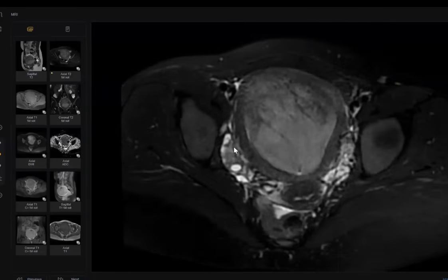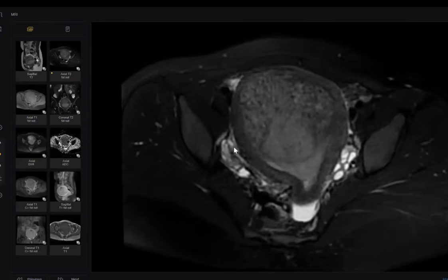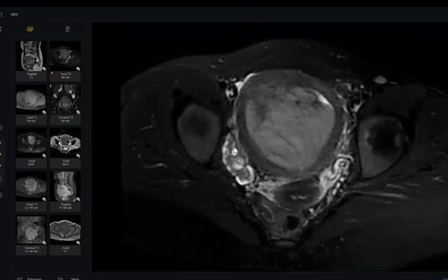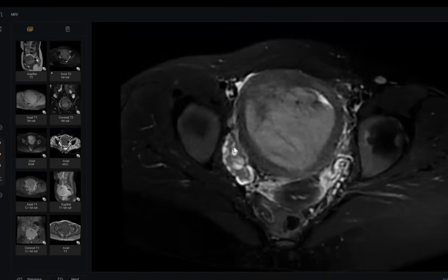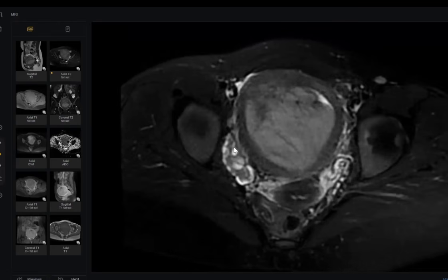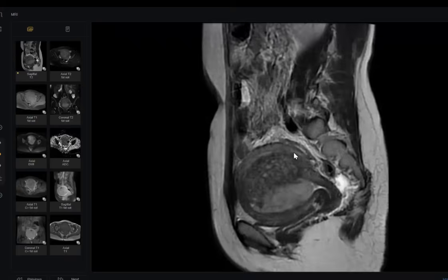Look here and choose. It is low signal intensity. What else? Is this endometrial malignancy or myometrial malignancy and why? Where is the main bulk of the lesion? Look here or here? The endometrial cavity. Yes, in the endometrial cavity.